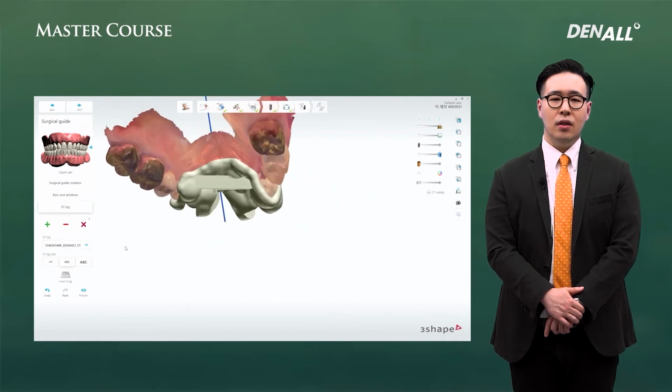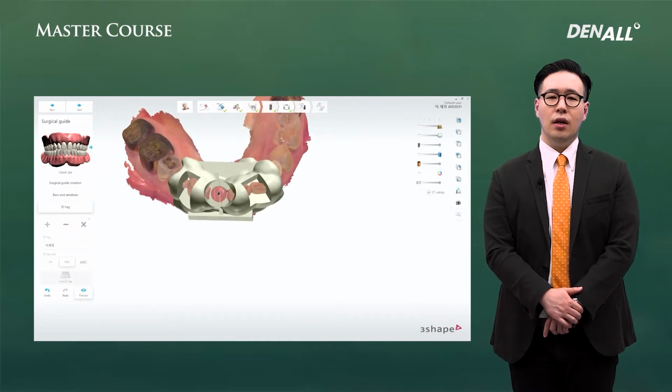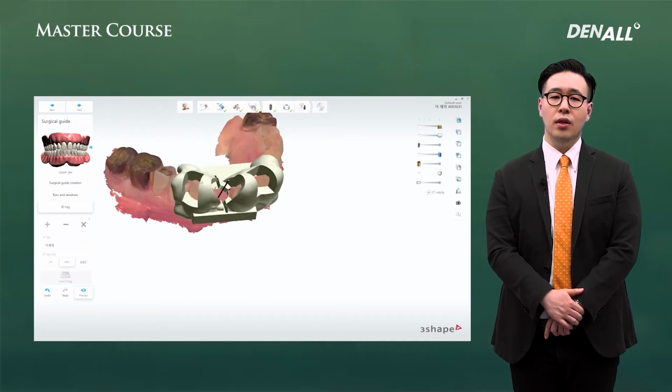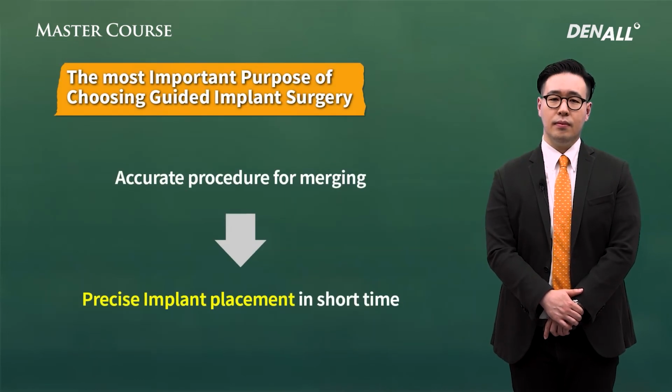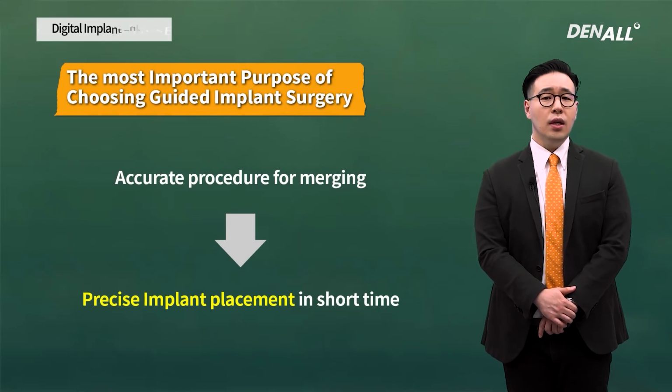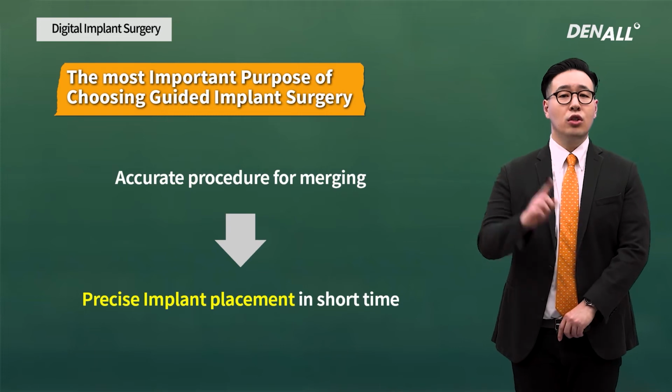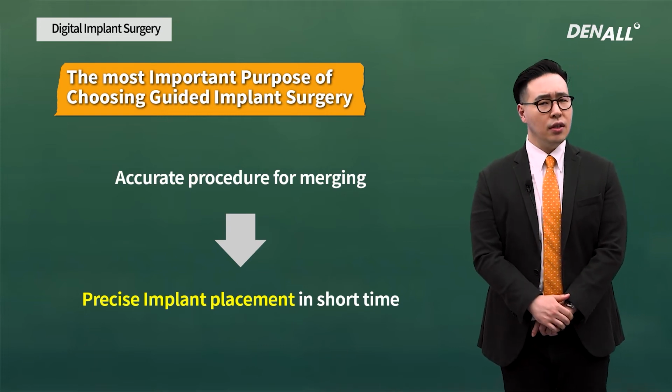After the adjustment, the appearance of the guide to be printed out is on the display. To prevent errors, the names of the patient and clinic can be included. Like this, both aesthetics and long-term survival of an implant should be satisfied for anterior implant surgery.